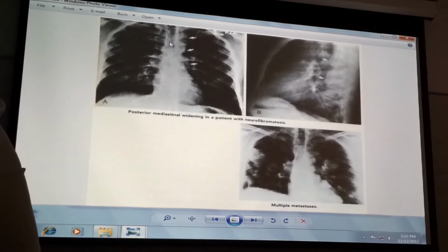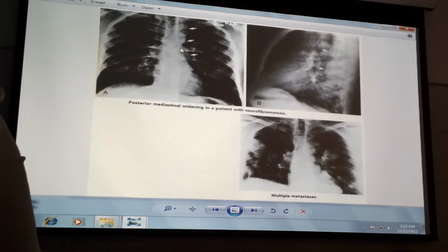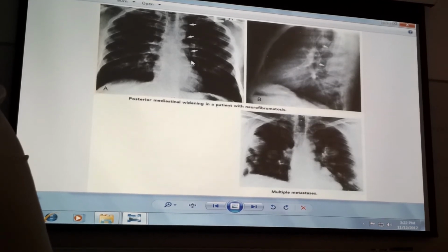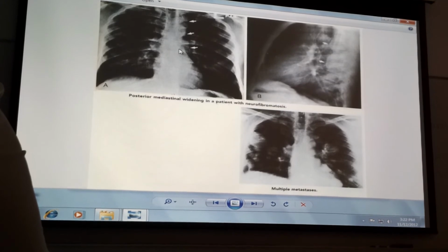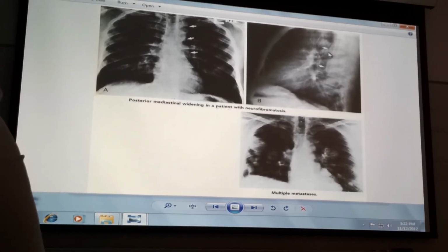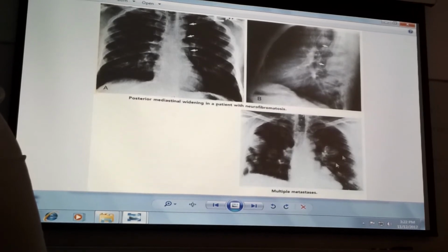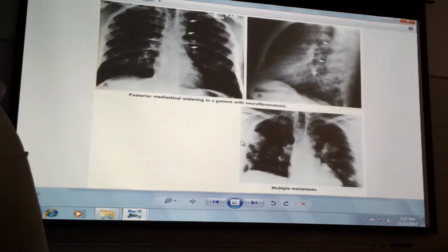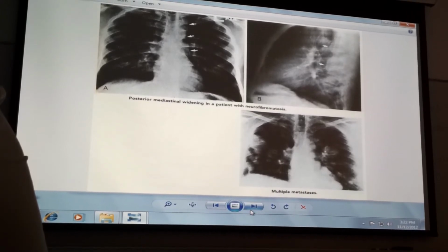And this is only showing you that in certain posterior mediastinal tumors, on a PA view, you can see that the contours are irregular. I know we spoke about contours and stuff like that. Until you do a lateral view, you can see this is probably a neurogenic tumor in the spinal cord. See that? All right. And this happens to be multiple circumscribed lesions in the chest, most likely metastatic, that vary in size and shape. All right? Good.